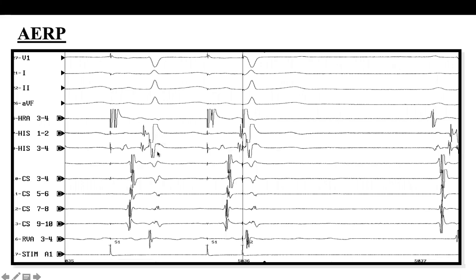This is the first. الكونسنتريك عادة ناخذها إذا كنا pacing في V rather than the A, يعني if we say that in retrograde conduction, هو اللي نركز على eccentric و concentric. So the pacing is in the right atrium. Yes. Then the H. Yes. Then the V. Yes. And the first one in the His, the V, HV.